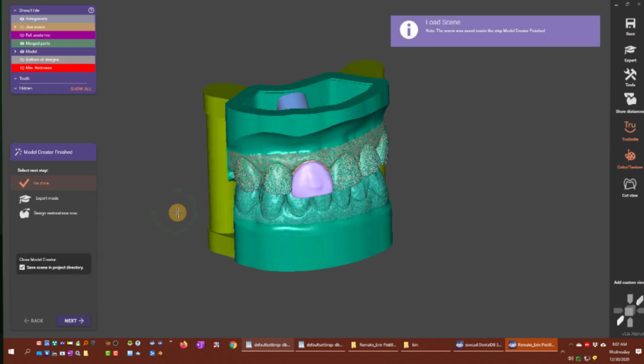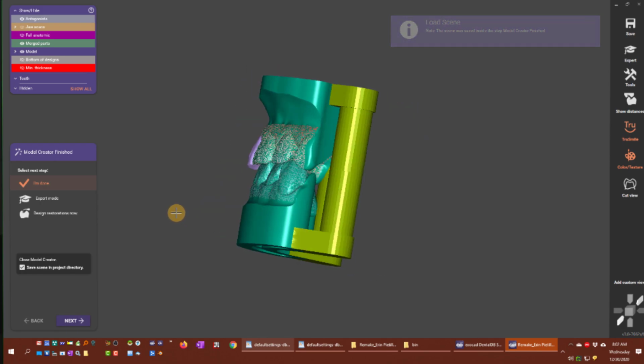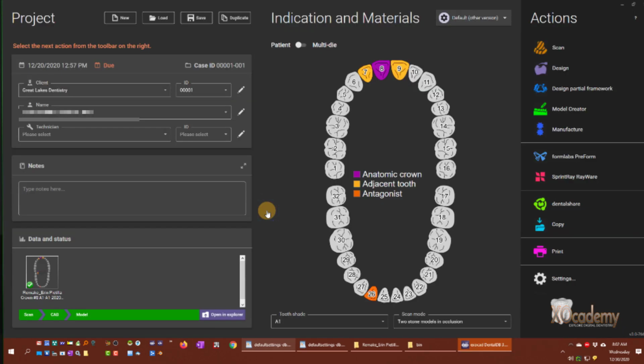And you can see, this is a case that was designed in a previous version. I've updated the new default settings to reflect where my CAD-DATA folder is, and I've updated the naming conventions for the folders and the files for each case.